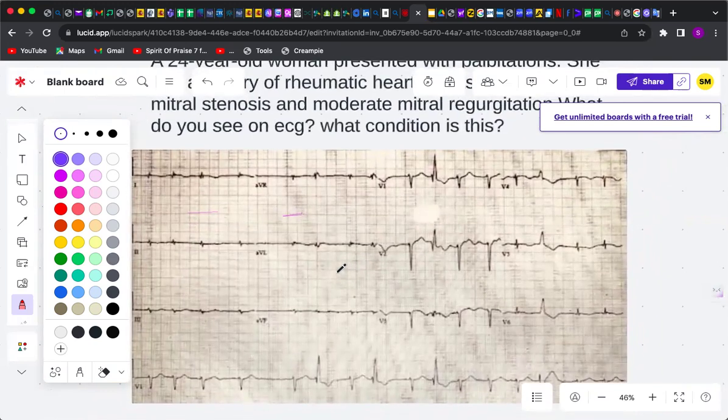And what did we find out from that case? Or what are we seeing here as well? So let's quickly go through that. Take a pause and then try to analyze the ECG. Just take a pause and try to analyze this ECG strip. A lot of comments came up when I shared it, actually, and I was really impressed with the answers and the suggestions.